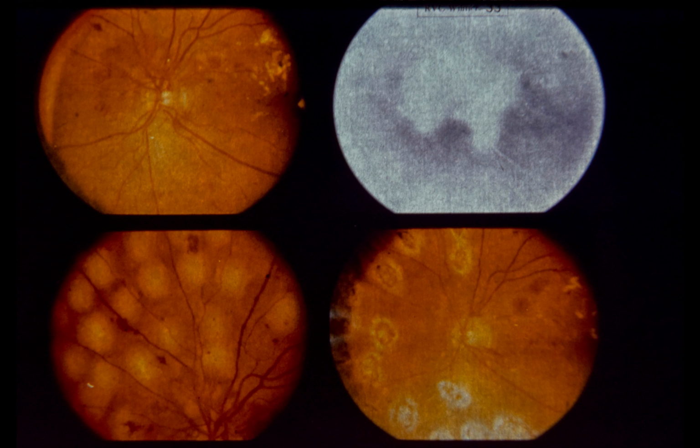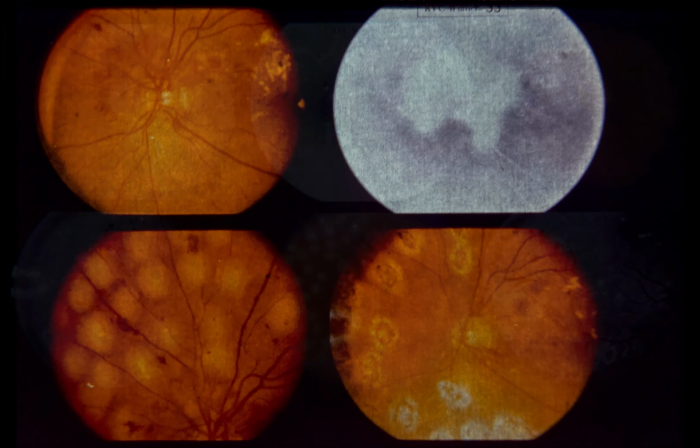As reported in the April 1976 issue of the American Journal of Ophthalmology, however, there was more visual field loss in patients treated with xenon arc photocoagulation than in eyes treated with argon laser photocoagulation in the patients participating in the Diabetic Retinopathy Study. The patient illustrated here demonstrates remarkable regression of disc new vessels following scatter xenon arc treatment.